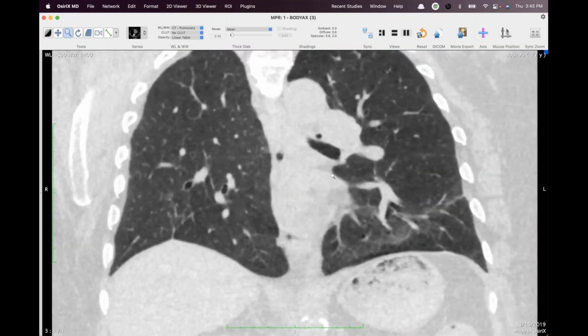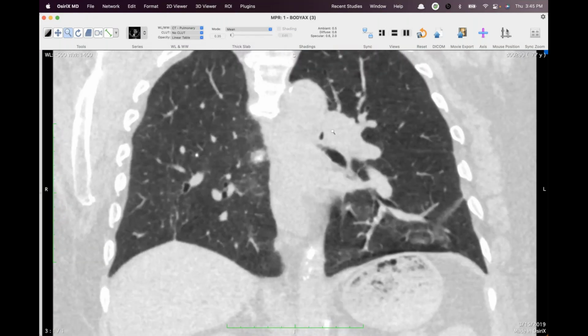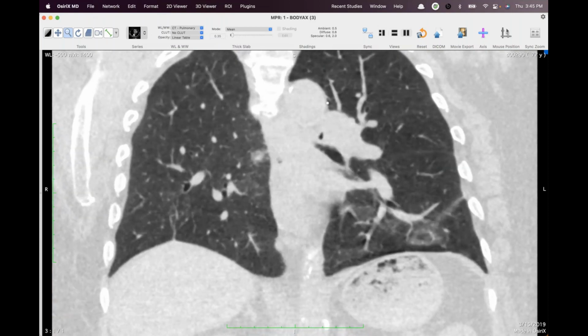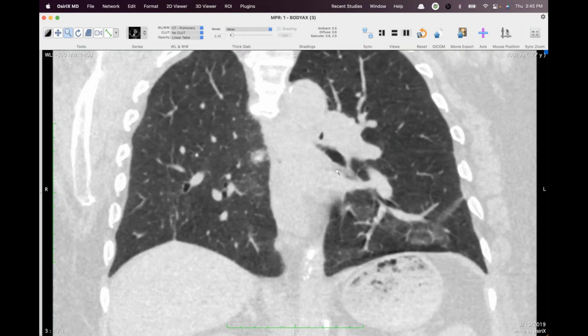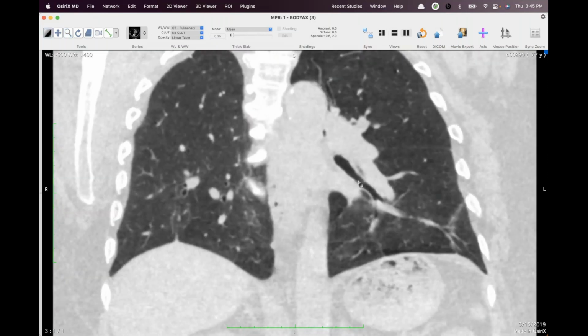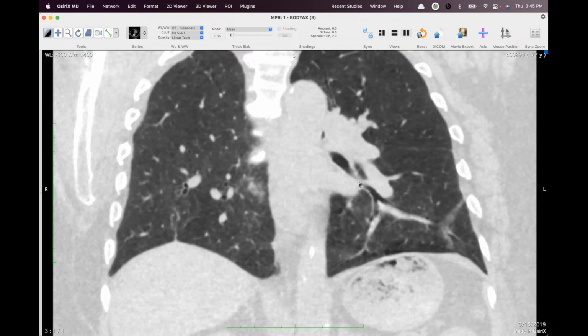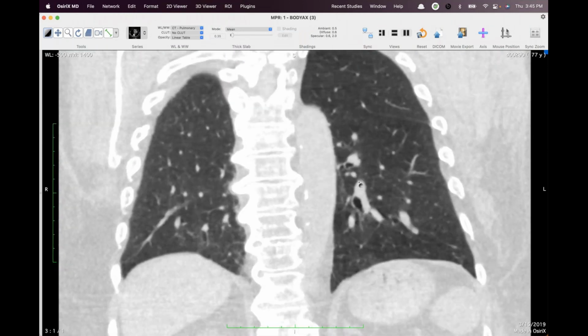But yeah, I don't know. I would just call it a displaced upper lobe bronchus. Whether it does technically go above the pulmonary artery, whereas everything else is going below it. Yeah, that's really interesting. It's joining the regular left upper lobe. It's not a separate little mini lobe up there.